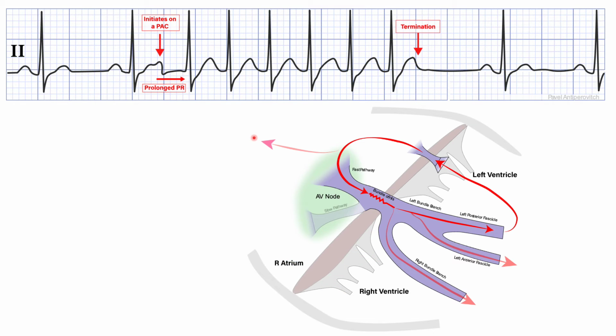Next, let's look at AVRT. AVRT very commonly initiates with a PAC, which blocks in the accessory pathway anterogradely, goes down the AV node, where we experience a physiological decrement, as we did with an atrial tachycardia, and then the AVRT initiates. So yes, this can certainly be explained by AVRT.